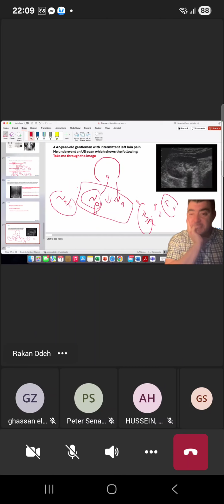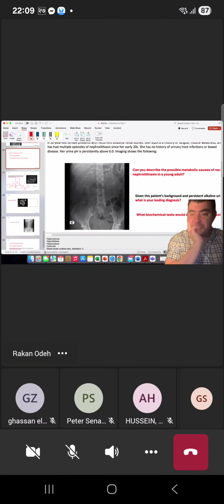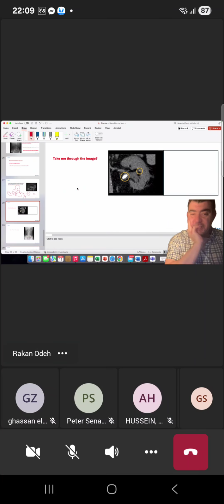Who's next? I can have it. I think this is the last one. Okay, let's go from here. Okay, so this is the patient. Fine, anyway, this is the last case. So this is the CT scan. Can you take me through it?